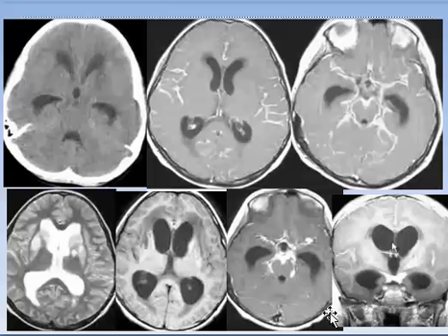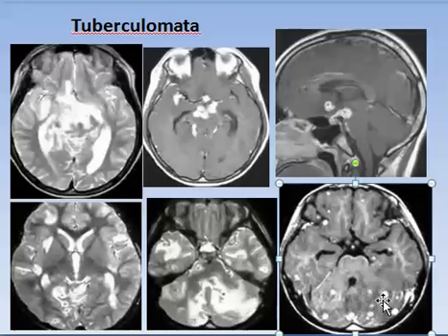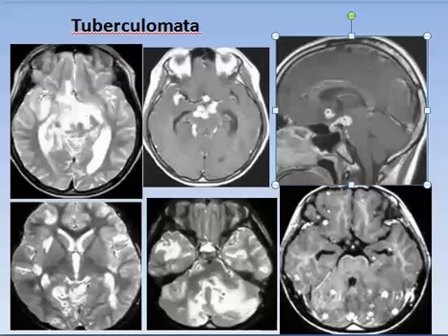Enhancing lesion here. Multiple enhancing lesions, with target appearance or without, solid or cavitating, with infarctions, multiple masses, and multiple miliary shadowing involving the whole parenchyma, associated with the typical basal distribution of tuberculomata, which are seen as small solid masses or small abscesses.